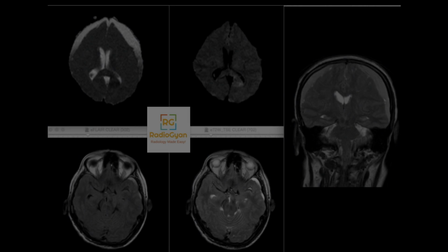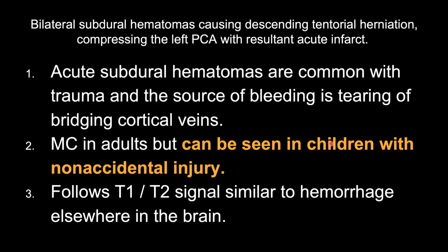So moving on to the diagnosis in this case. The complete diagnosis is bilateral subdural hematomas causing descending tentorial herniation, which is compressing the left PCA with a resultant acute infarct. I'll just go over these findings in this image.